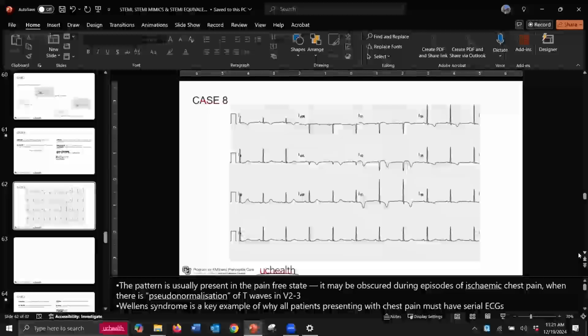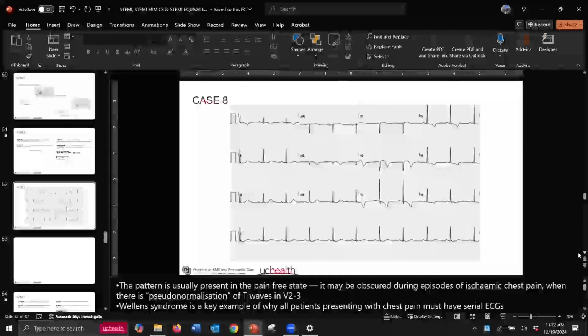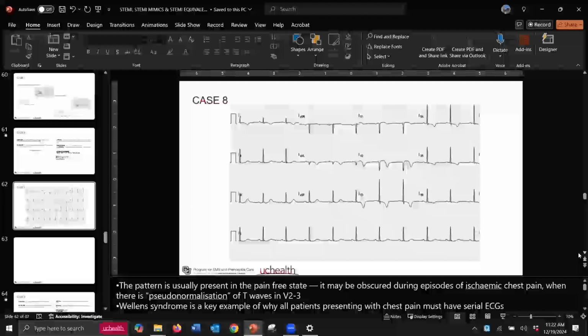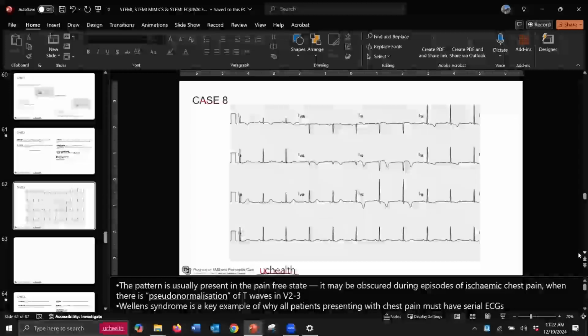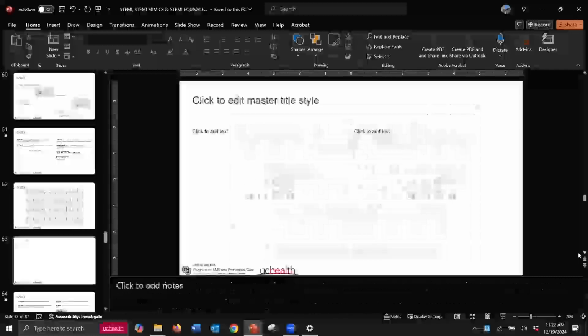So what's the difference? Time. Right? Absolutely. Do you need to go to the hospital? Absolutely. Yes, it's a STEMI equivalent. Absolutely needs to go in. And hopefully, they do the normal or appropriate diagnostics and get this guy out, because he is having some coronary vascular issues.